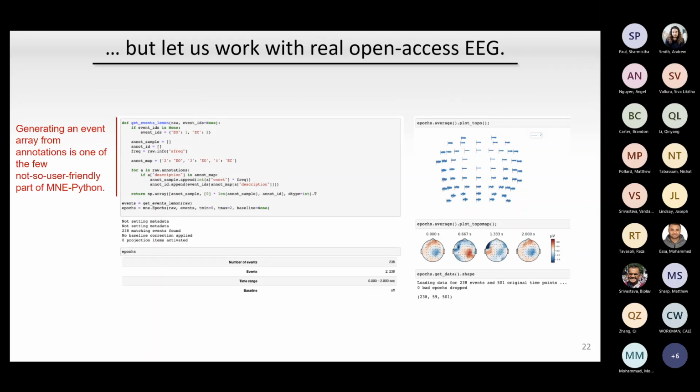Now, what you would want to do typically in EEG is, well, most EEG recordings will be epoched in their structure. So you have some paradigm where you give a stimulus, repeated, and you want to epoch your data by window according to that stimulus. So that's the epoching part.